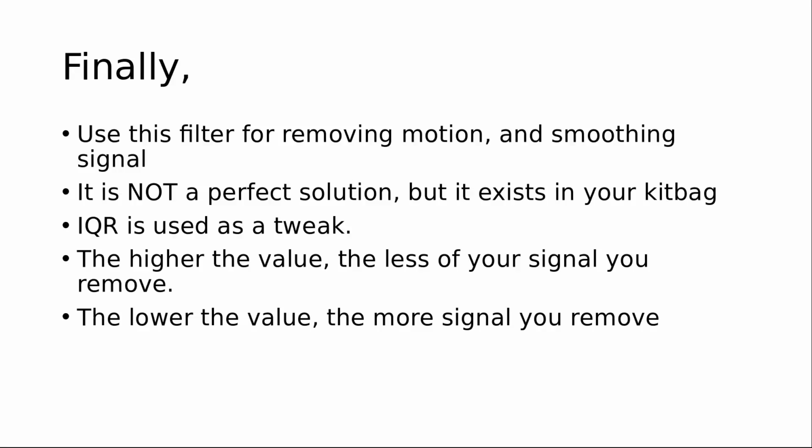The input variable is simply a tweak to allow you to see how much you feel comfortable removing. And finally, again, the higher the value, the less of the signal you remove, and the lower the value, the more of the signal you remove.